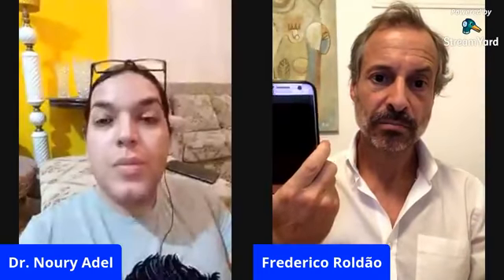So there is the 3D simulation part, there's the communication with patients part, there's the marketing part, etc., etc. And the other big advantage is that being cloud-based, anyone from anywhere can create their own 3D just using a mobile phone like this. So you could just take three photos of yourself, upload them, and within seconds you could look at your 3D right here on the screen.